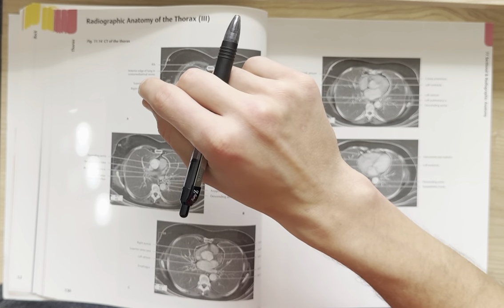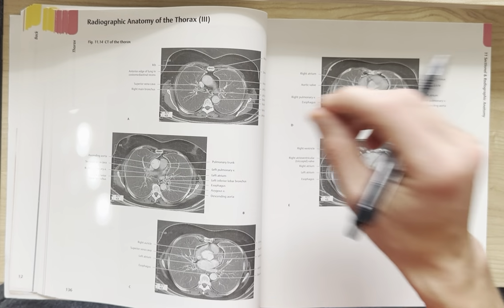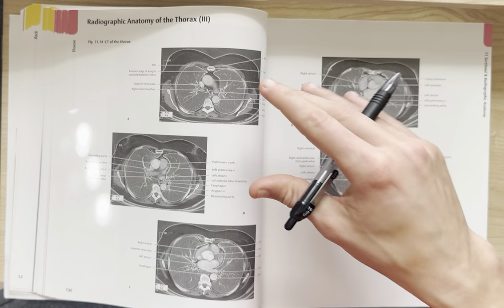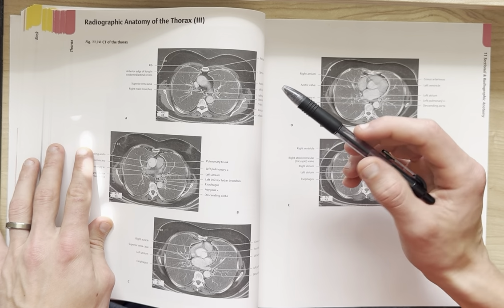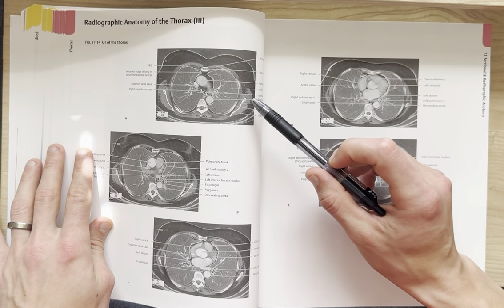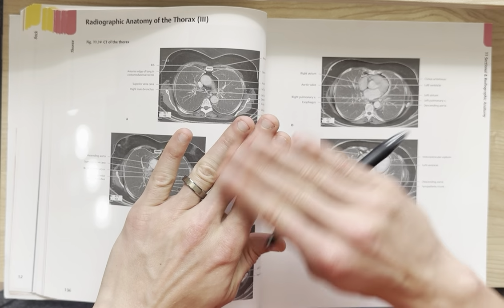A CT does it complexly, because it's basically a bunch of X-ray transmitters all around this loop that hit the patient with radiation. But the contrast between the CT and the X-ray is that extra radiation is utilized to get very good contrast imaging, and then the CT layers them on top of each other so that it's just a bunch of slices.